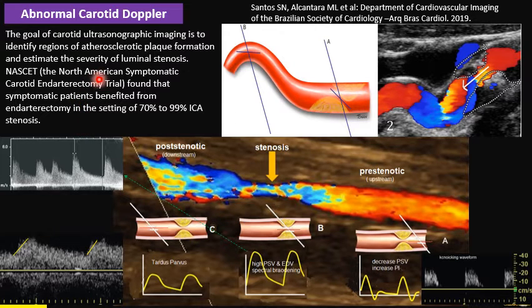The most important principle for doing correct spectral Doppler is that our angle correction line or cursor be parallel to the luminal blood flow, not parallel to the wall, parallel to the blood flow. As you can see in this cartoon, even though the wall is horizontal this way, in the turbulent or aliasing blood flow in the lumen at the level of the stenosis it is this way.